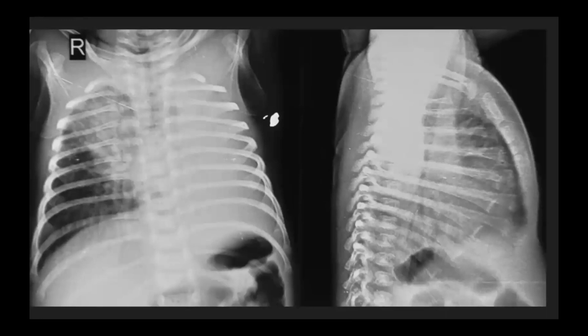This is the lateral radiograph which was performed, which shows the spine sign. So this lateral actually helped in that it showed it is a pulmonary pathology. It didn't add anything much in any other way. But here we can see the retrosternal lucency is maintained. So mediastinal mass it is not. It is a pulmonary pathology and it is bilateral. In the AP radiograph, we can see the carina very well. So both the bronchi are seen well.